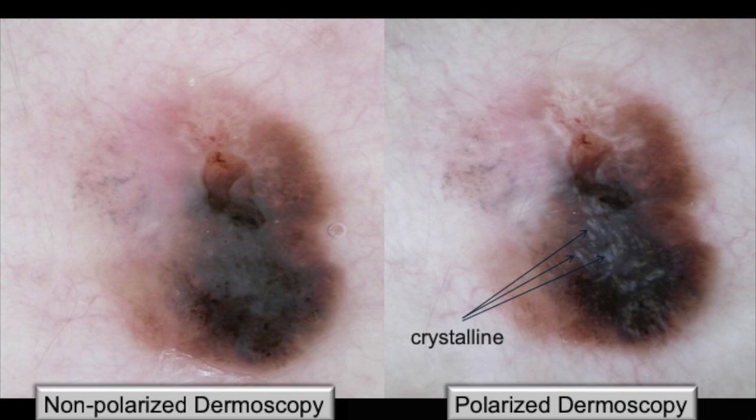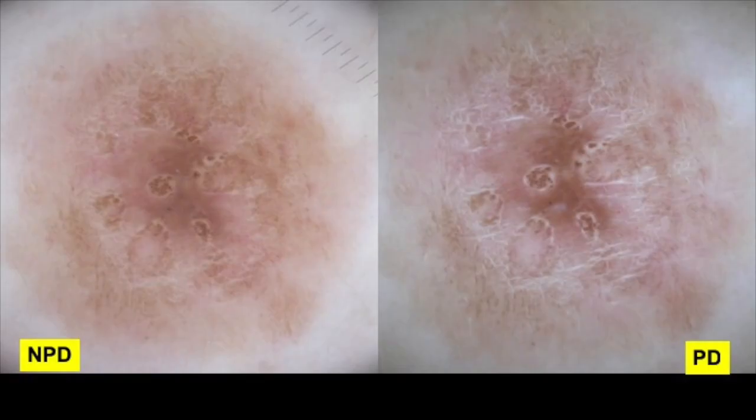So here's a melanoma. On the left-hand side, you see it with standard light dermoscopy. On the right-hand side, it's with polarized light dermoscopy. The shiny white lines can only be seen with polarized light, and they're very clearly shown here. Most of them parallel, but some of them are running at 90 degrees, so orthogonal to each other. Here's a hypomelanotic melanoma, but again, under polarized light, all you see are shiny white lines throughout the lesion, both parallel and orthogonal to each other.